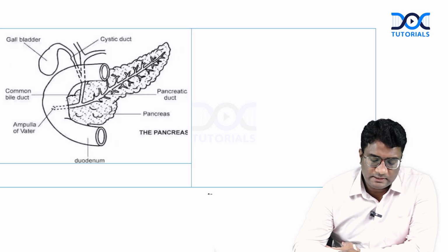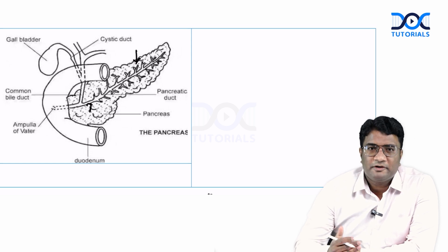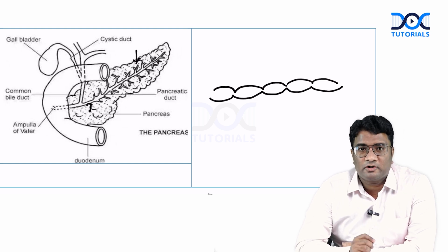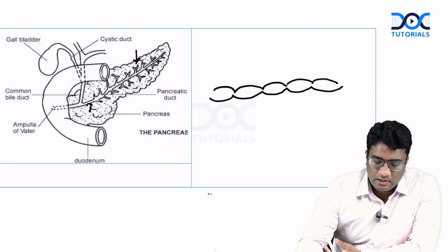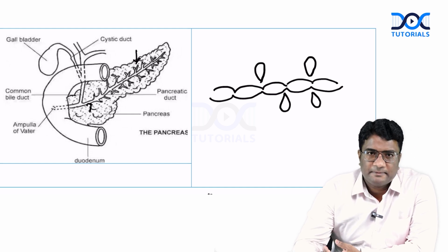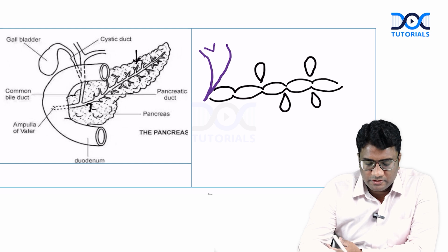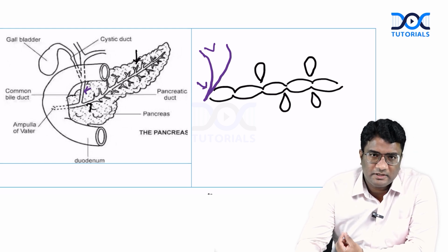Look at here. This is the pancreas. It is having the main pancreatic duct and the side branches that you have. So when you have chronic inflammation of the pancreas, you see stricture and dilatation of the main pancreatic duct, producing a corkscrew appearance or tortuous appearance or beaded appearance of the main pancreatic duct. The stricture and dilatation of the side branches produces chain of lake appearance. The fibrosis of the distal CBD produces narrowing of the distal CBD. The CBD, when it is passing through the pancreas, gets into fibrosis, producing distal CBD stricture.